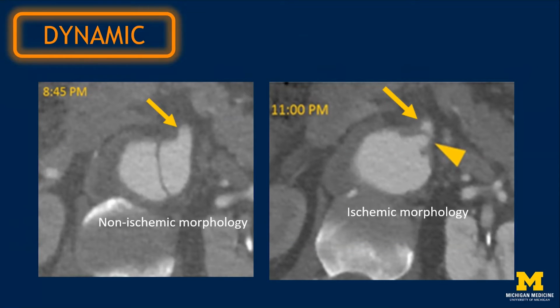Quickly, the patient's blood pressure elevates. He becomes more symptomatic. He develops symptoms of gut ischemia. And on the right image, we see now that the true lumen is collapsed and the dissection flap is draping over, if not even protruding into, the proximal SMA, which is now compromised.